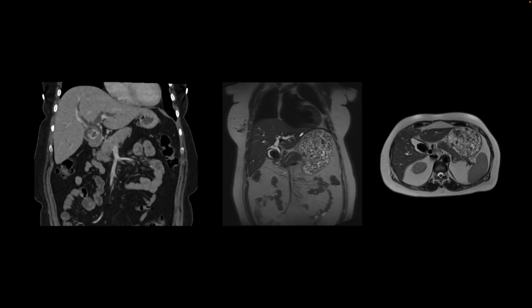Here's our next patient, and this finding is very interesting. They presented with abdominal pain. We acquired a CT that shows a large stone that is in the neck of the gallbladder. We see intrahepatic biliary ductal dilatation as well. On the MR images, we find that that's the stone that is stuck in the gallbladder, and in such a way that it is having mass effect on the distal extrahepatic CBD, leading to intrahepatic biliary ductal dilatation.